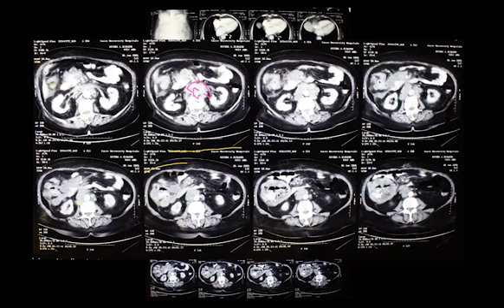Can you count them? What is their shape and what is their outline? Lobulated. So their surface has lobules, yes. In one cut, at least the one just to the right of the one you're pointing to, they appear to be. Are they multiple or single? In some cuts they're multiple. You can count them at least: 1, 2, 3, 4, 5, 6, 7, 8, something of the sort. What do you think they can be? Are they retro or intraperitoneal? Retroperitoneal. Multiple hypodense lesions surrounding the aorta are probably... What is the most probable diagnosis?